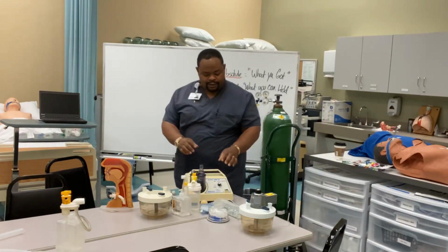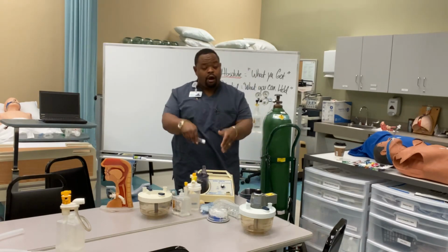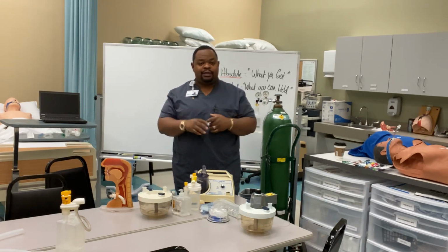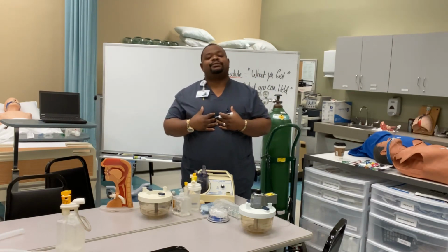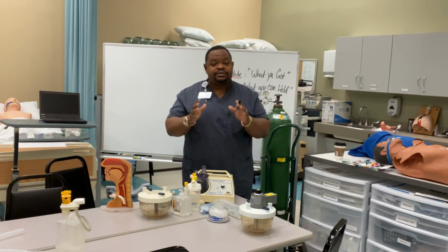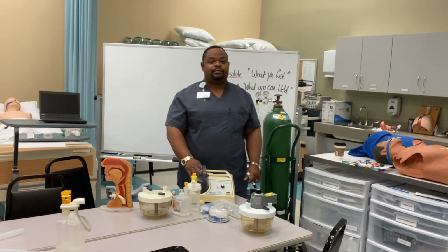The ultrasonic nebulizer boasts that 90% of their particles will be 0.5 to 3 microns. They say if you buy my nebulizer, I can guarantee that 90% of the particles coming out of this nebulizer will be between 0.5 and 3 microns.